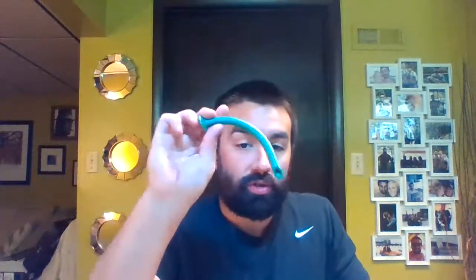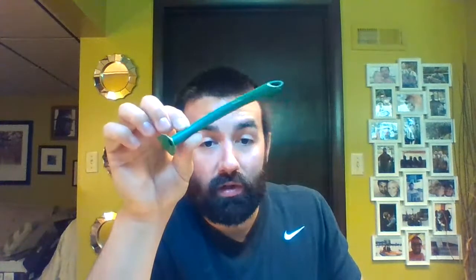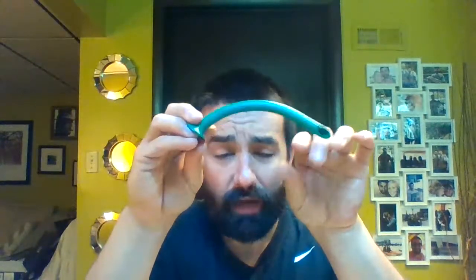Okay, so then we have the nasopharyngeal airway, the nasal trumpet, the NPA. These can also serve a similar purpose. They can keep the tongue from occluding and falling against the back of the airway if you size it properly. Although the most frequent indication for seeing a nasal trumpet or these nasal airways is probably frequent nasotracheal suction. All right, so once again, it's important to measure these properly, especially if you're trying to use it as an airway adjunct to keep the airway open.